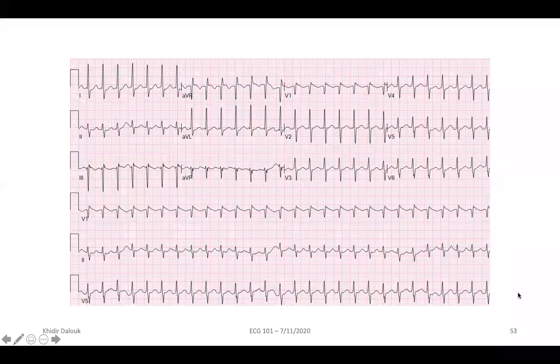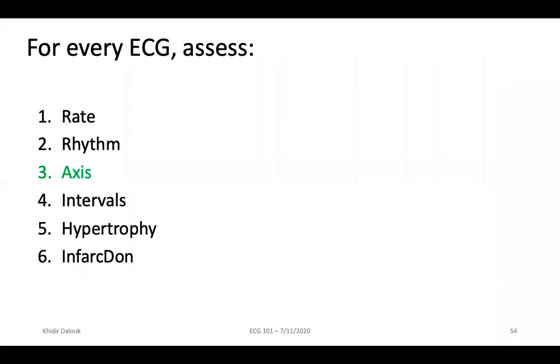In electrophysiology, we use calipers to mark out if things are regular or irregular. You can use a piece of paper and just put dots and see if they march through, and that will tell you if it's regular or not. And I do not see any discrete P waves. So this is a fast, narrow complex tachycardia. Most of the time when we refer to a fast, narrow complex tachycardia, we generally call it an SVT, supraventricular tachycardia.